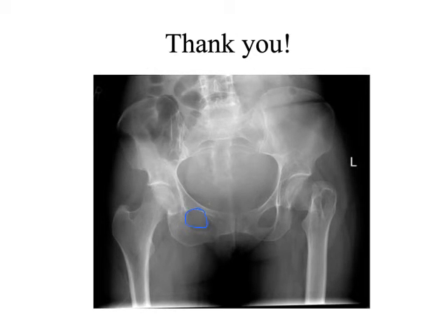We can actually, it's kind of interesting. We know this is a radiograph, right? Like this is actual film. There's a number of things that are kind of tipping us off here. We can see this gradient right down here. Do you see that? That fall off radiation. So we know that they actually collimated on this image, and we have some fall off radiation that's resulting from that, a little bit of scatter off of the patient.